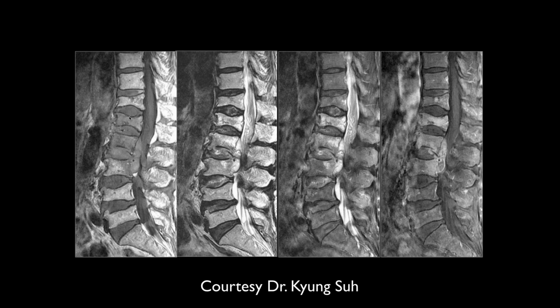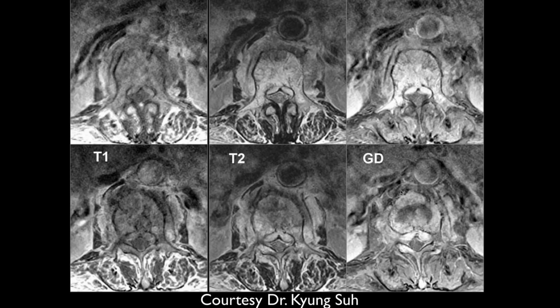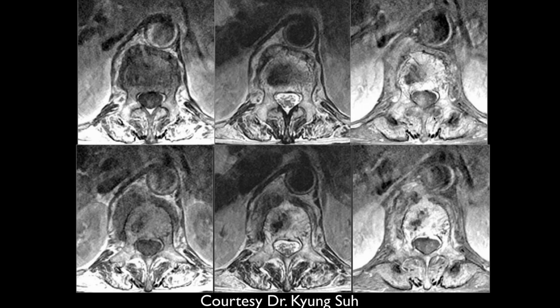phlegmon. So 1, 2, and 3 vertebral bodies are all abnormal. Right, with large area of epidural collections back, which is enhancing. So epidural abscess. So some collapse, vertebra, epidural. Anything in the soft tissue? So mostly within the disc and the vertebral body and epidural area, and some phlegmon around the vertebral body.